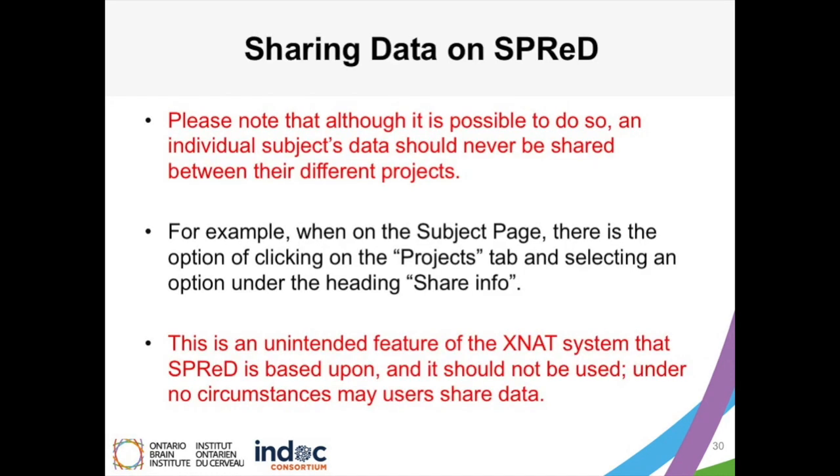Sharing data on SPReD. Please note that although it is possible to do so, an individual's subject data should never be shared between their different projects. For example, when on the subject page, there will be an option of clicking on the Projects tab and selecting an option under the header Share Info. This is an unintended feature of the XNAT system that SPReD is based upon, and it should not be used under any circumstances to share user data.